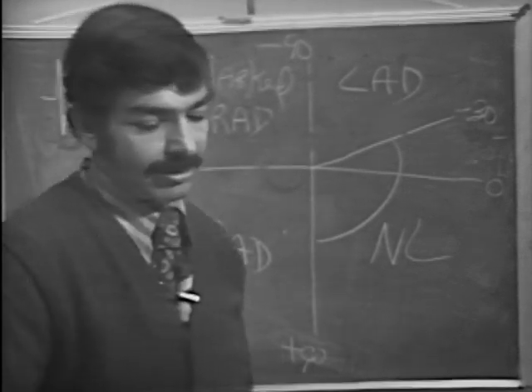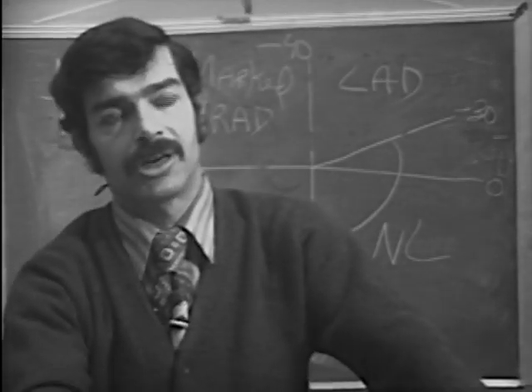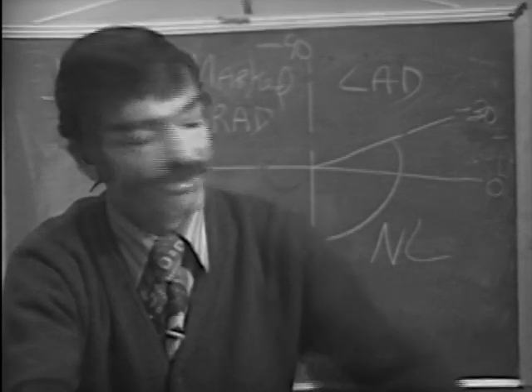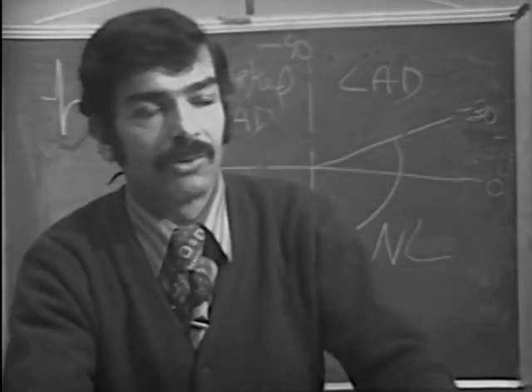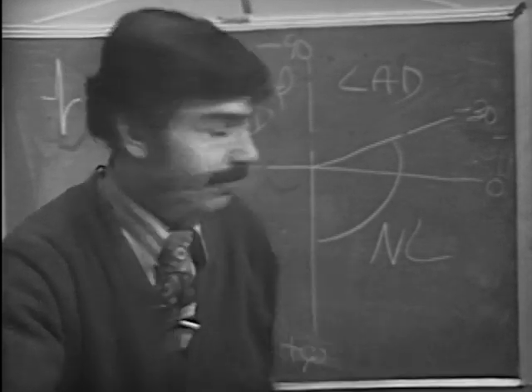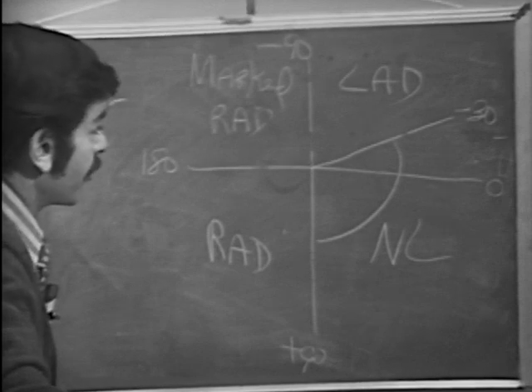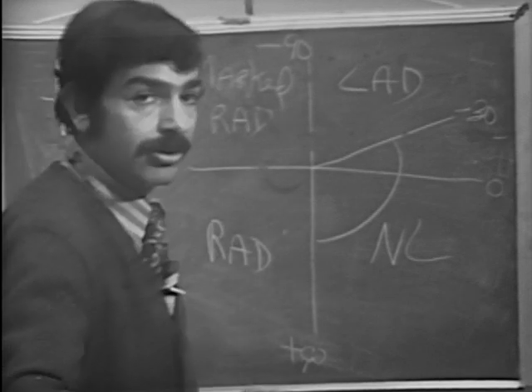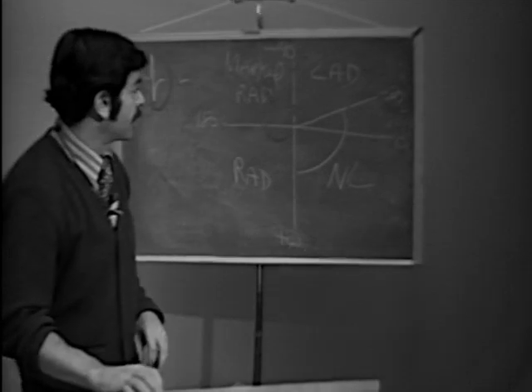But the thing that is really helpful to remember is, if you have a confusing electrocardiogram you can't really make anything out of, and you see an axis that's going straight up in the air or over in this direction, you should think of one thing. What? Pulmonary disease. Frequently, patients with pulmonary disease have these strange axes. They go straight up or slightly into this marked right axis deviation quadrant. It's a worthwhile, useful thing to keep in mind.